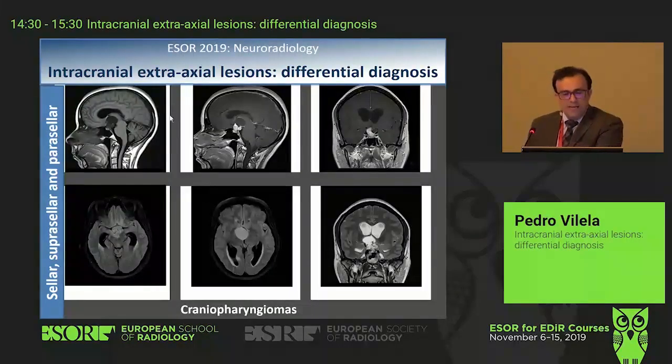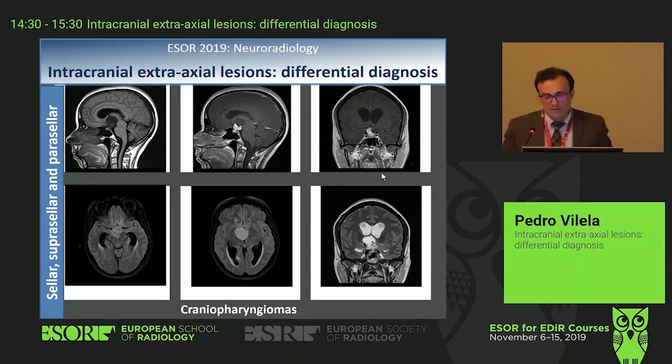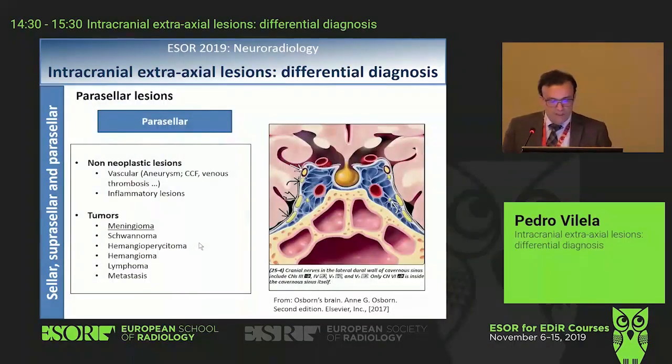And you see here an MR, so you see different cysts with different signal intensities, and you see the solid component that is actually enhancing with contrast. In this case, compressing the ventricles and causing a hydrocephalus.